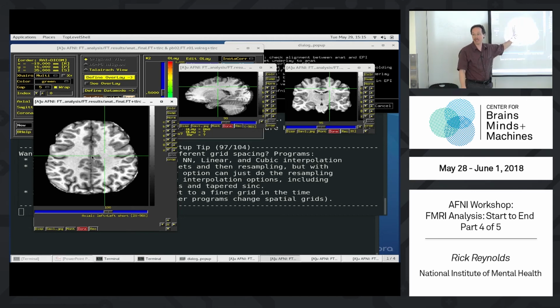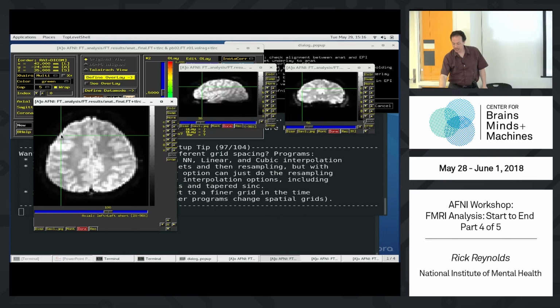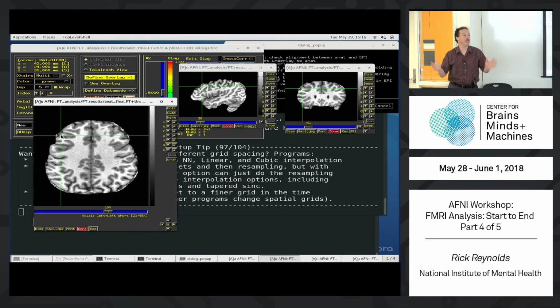But by eye is how we've actually caught this. If you don't look at your data, you wouldn't catch it, and then maybe your big find on the left side of the brain is really on the right side of the brain. So it's fairly interesting, and anyway, it's educational if nothing else. But it's a very solid way to test alignment.